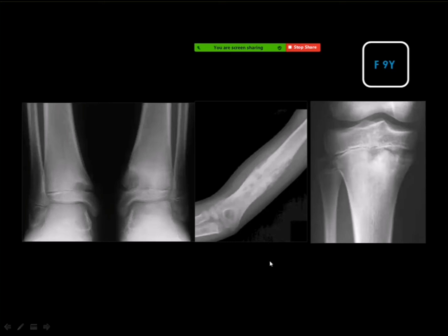Okay, which type of neoplasm in this age group? Maybe lymphoma. But even sarcoma, even sarcoma is not multiple. This does not look like Ewing sarcoma, of course, and you got some erosive changes in the humerus.